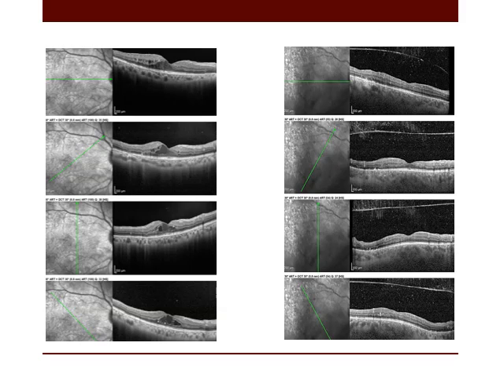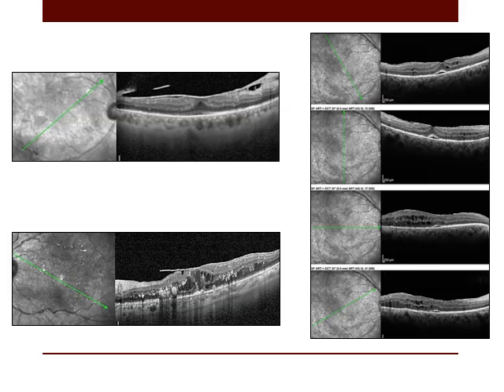Now, as we can see, this is a patient with no vitreomacular interface abnormalities, a lucky one. However, the other patient with PVD, and I think the PVD in this patient induced vitreous hemorrhage. As you can see, the hyperreflective foci of hemorrhage anterior and posterior to the cortical vitreous, tightly adherent epiretinal membrane, inducing tangential traction on the macula.